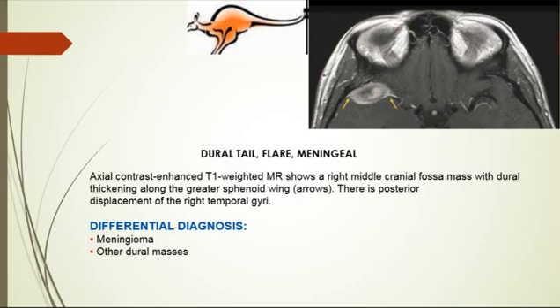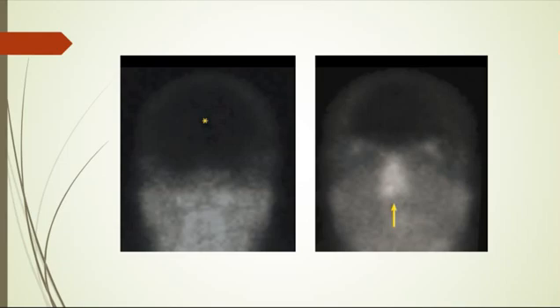Now, the next one is an important sign. It's interesting. What is there? What's going on? What's this? Hot nose sign, or empty light bulb sign, hollow skull sign. It indicates brain death. Exactly. What is the exam? It's a nuclear study, of course. This is a technetium HMPAO. Okay.